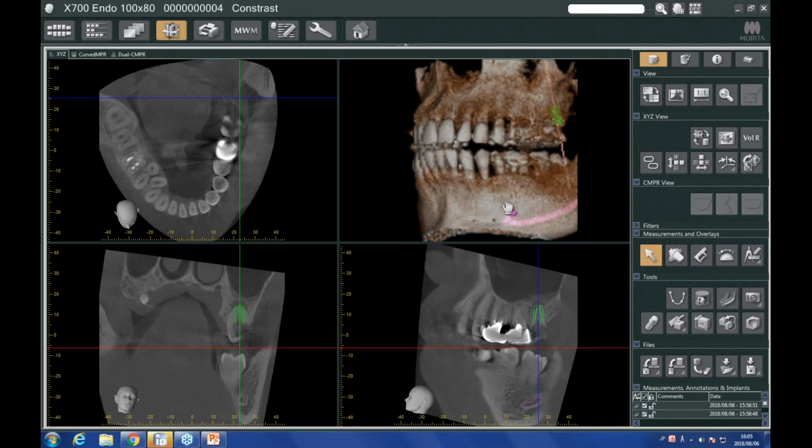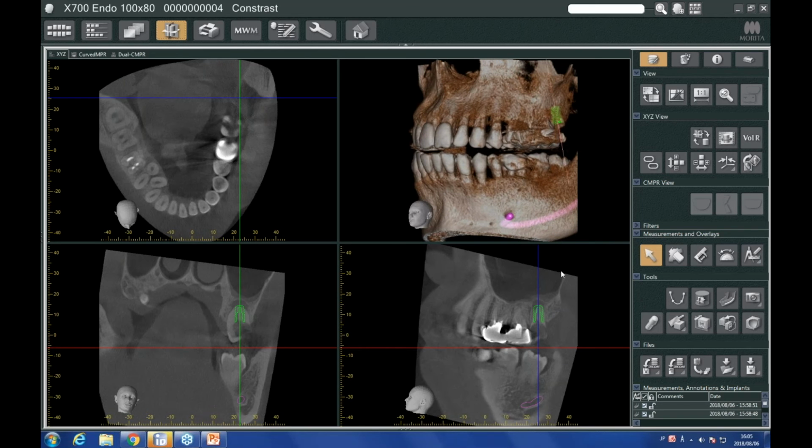I know it's very disturbing sounding, but we can actually do this using the cutting tools within the i-Dixel software. So the cutting tools are located down here in the tools section. If you click on this static volume cuts selection, you can see that we can remove the upper portion, this dotted line here, or the lower portion of the axial slice.